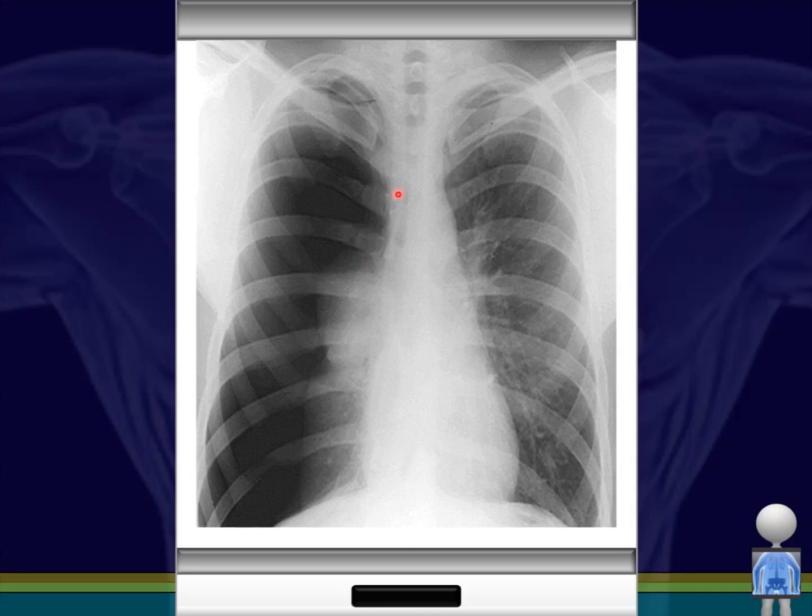Now the other thing you look for in pneumothorax, and we're not quite there yet on this one, but we're close, you always want to rule out tension. The trachea here is still midline, the cardiac structures and the mediastinum remain midline. This patient does not yet have tension pneumothorax, but this is a big pneumo and it won't take long to start pushing this way. And once we start to see these central structures shift, then we know that we have tension. Hopefully we don't get there.